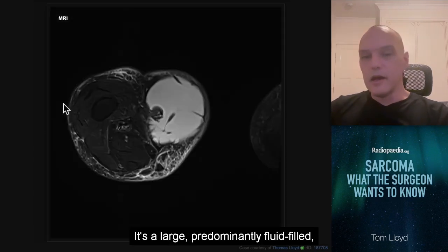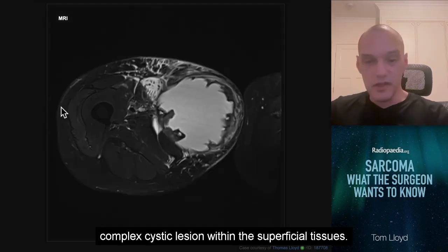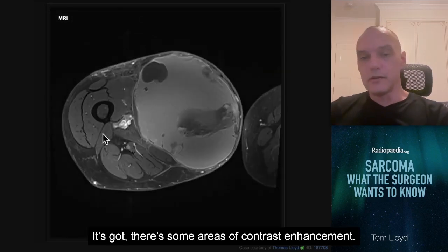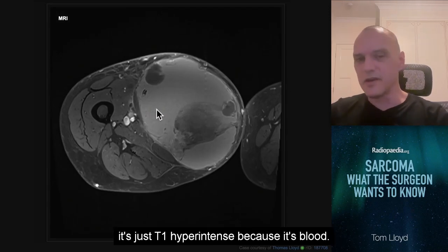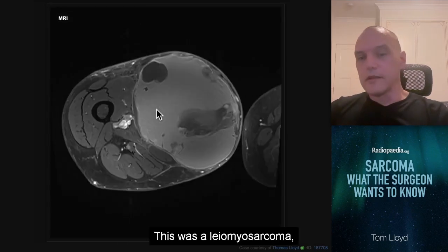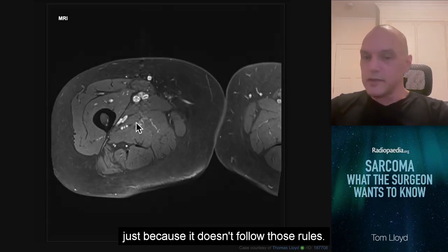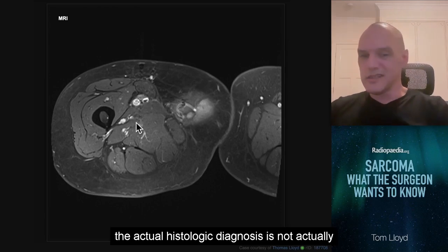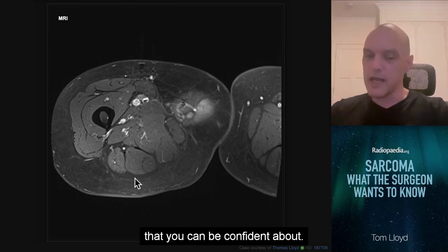It's a large, predominantly fluid-filled, complex cystic lesion within the superficial tissues. It's got a lot of edema around it. It's got some areas of contrast enhancement. A lot of this stuff isn't really enhancement. It's just T1 hyperintense because it's blood. This was a leiomyosarcoma, and this is not one that you'd be confident in diagnosing just because it doesn't follow those rules. So oftentimes the actual histologic diagnosis is not actually that relevant unless it's got specific features that you can be confident about.